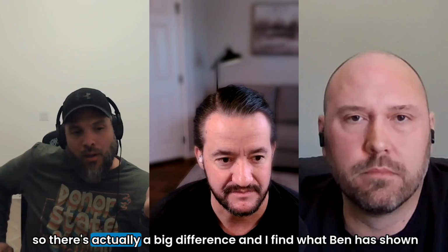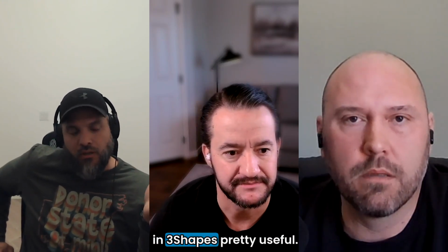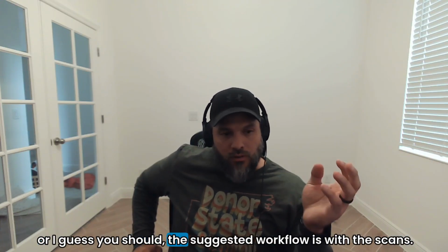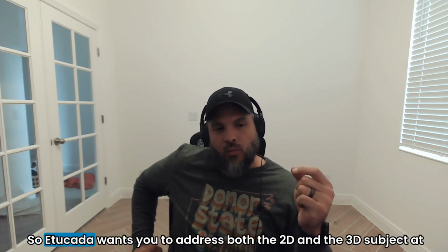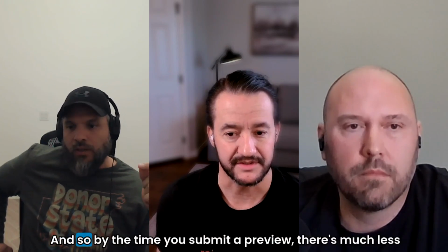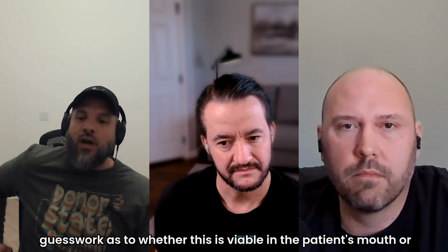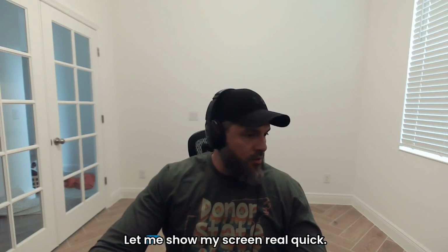So there's actually a big difference, and I find what Ben has shown in 3Shape pretty useful. Now, Exocad has done it to where you can only do your smile design, or I guess the suggested workflow is with the scans. So Exocad wants you to address both the 2D and the 3D subject at once. And so by the time you submit a preview, there's much less guesswork as to whether this is viable in the patient's mouth or not. So let me go through the process here. Let me show my screen real quick.